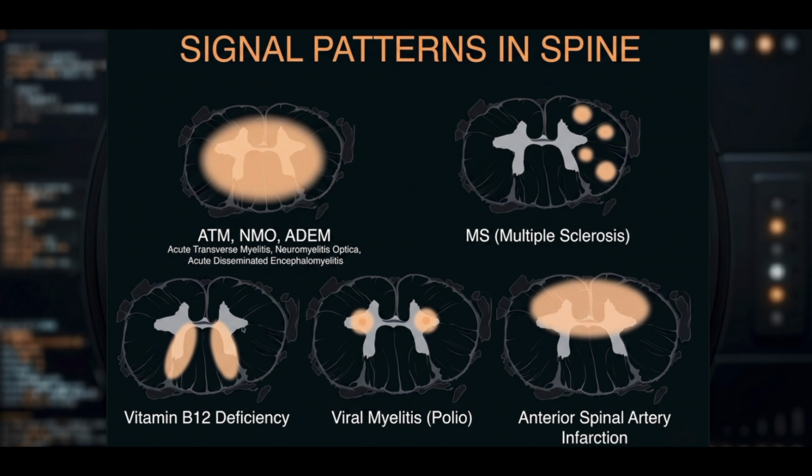spinal cord. Very characteristic changes we see in case of vitamin B12 deficiency, which shows like an inverted V letter in the posterior tracts, with high signal intensity in the posterior part of the spinal cord. And the case that we had today of the polio with anterior owl eyes bilaterally, and finally we can see the anterior spinal artery infarction.